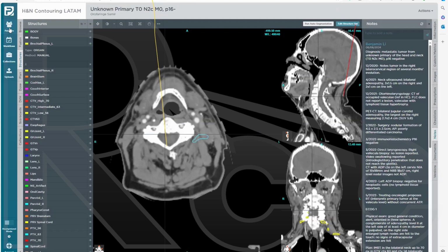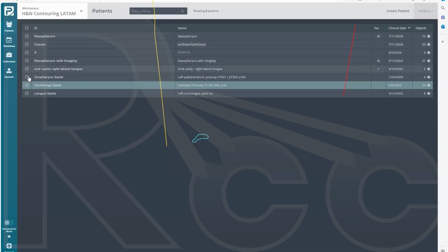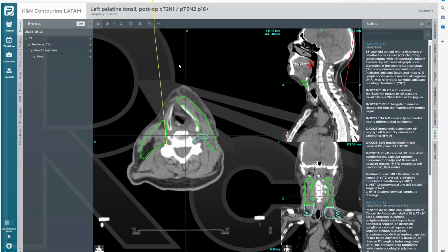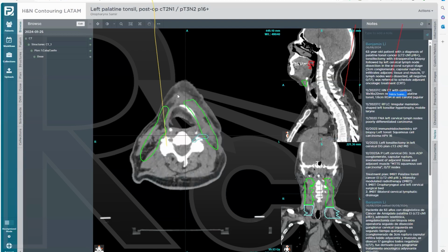Let's bring up, I think we have one more case I wanted to show here. Let's see. All right, let's see. Dr. Gonzalez-Mota, can we just erase this? I think we just have some. Yes, of course. Oh, no worries.